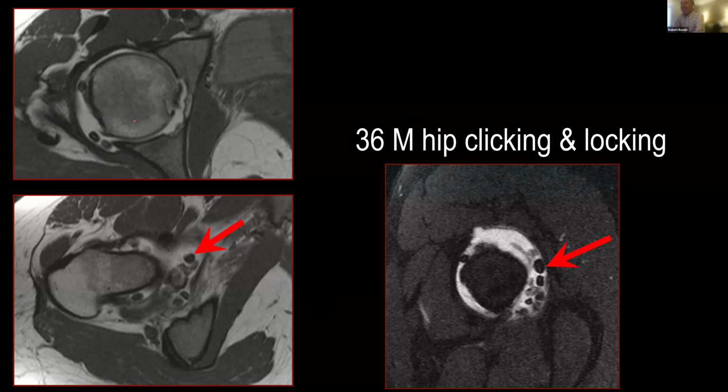Yeah, there are so many measurements in the hip and pelvis, of course. On every cross-sectional imaging exam, we make a bunch of measurements, including the alpha angle. There's a correlate on radiography that is commonly done for FAI and other young hip patients. We typically get a false profile view radiographically as well. My favorite and I think most useful measurement on an AP pelvis is looking at the lateral center edge angle.